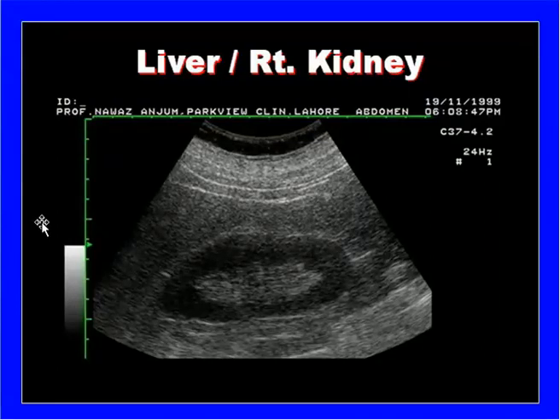This picture is just to show the difference between the echogenicity of the renal cortex and the adjacent liver. Whenever there is a fatty liver, it becomes more echogenic and the adjacent kidney cortex appears rather hypoechogenic. Otherwise, the kidney is normal.